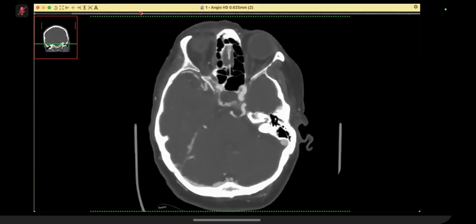What is your conclusion, please? This is an anomalous arterial entity of the circle of Willis. I think it's a persistent fetal posterior cerebral artery. Okay, thank you. Thank you very much.